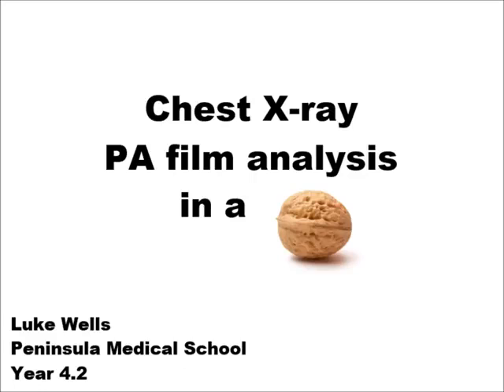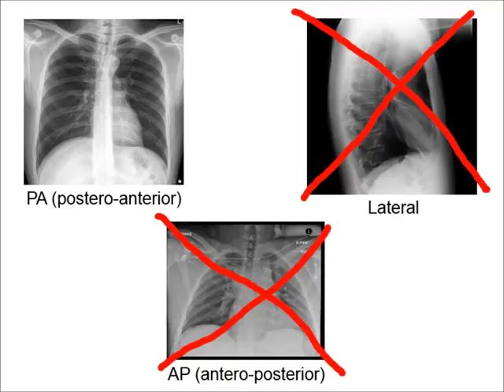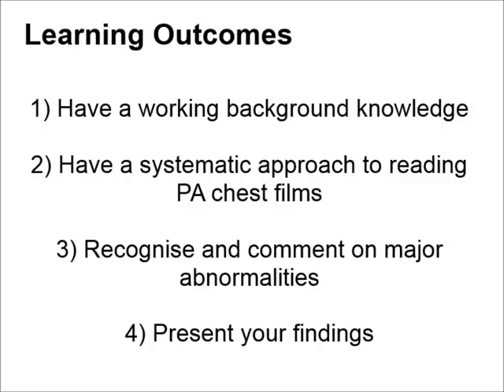PA chest radiograph. Reading a chest x-ray is a vital skill for medical students and doctors, and often comes up in exams. While there are other chest film views, PA is the most useful and by far the most common view you will encounter, so this is what I'll be teaching in this short video. As this video is teaching the skill of reading a chest x-ray, I will not cover the more advanced skill of how to diagnose particular chest pathologies.